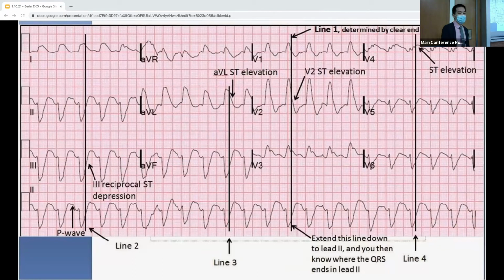Again, I don't want to spend too much time on it. I think we all just kind of need to spend time. It's just a lot of pattern recognition. But this is certainly something that I think most of us would at least look at and be like, bad news. So keep that in mind.